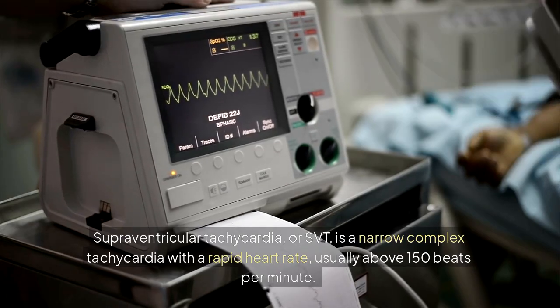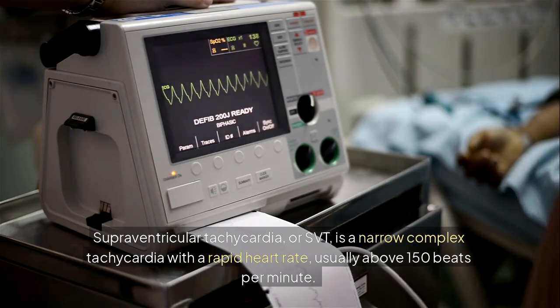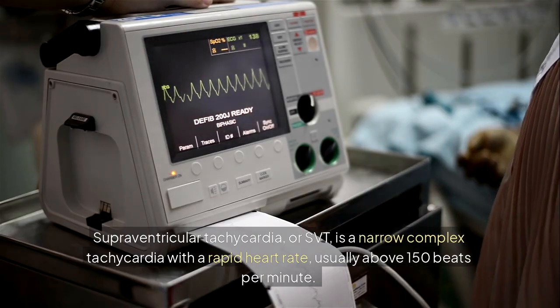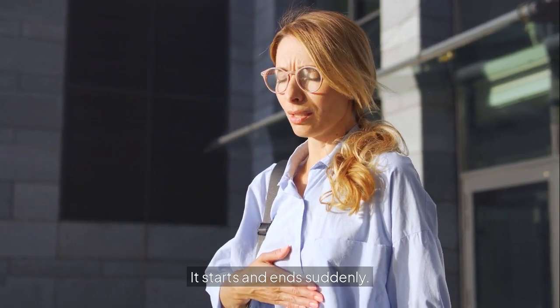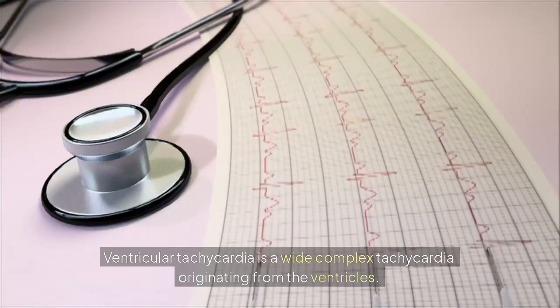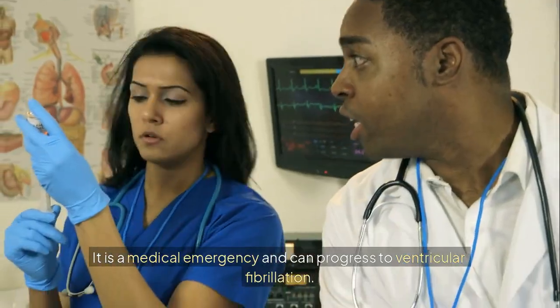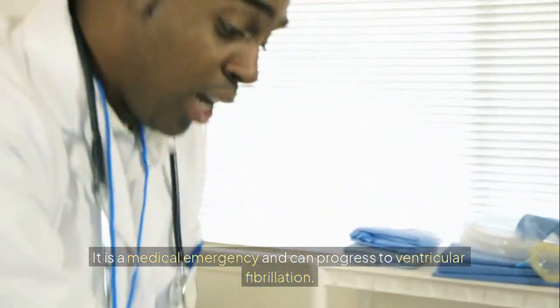Supraventricular tachycardia, or SVT, is a narrow complex tachycardia with a rapid heart rate, usually above 150 beats per minute. It starts and ends suddenly. Ventricular tachycardia is a wide complex tachycardia originating from the ventricles. It is a medical emergency and can progress to ventricular fibrillation.